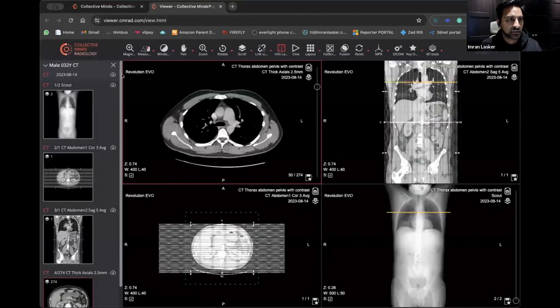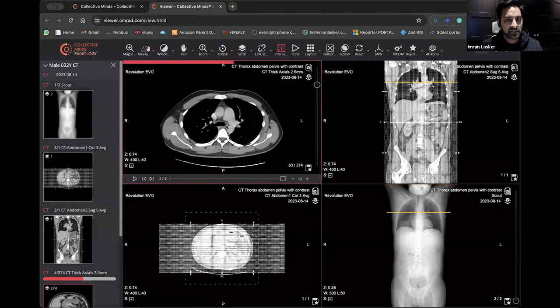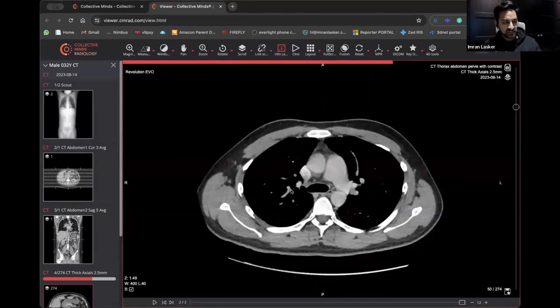Okay, so let's have a look at this one. This is just to illustrate what some lung findings look like for those of you that are reporting chest x-rays. Sometimes people will just say consolidation, consolidation, consolidation without really thinking about what consolidation really is. I've said this on previous lectures, but I've found this really good example of what we're going to talk about now.